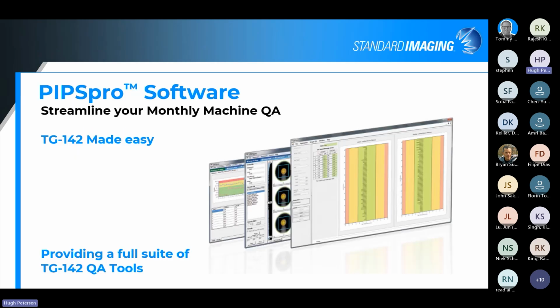So that's an overview of the CT simulator component of it. But just a quick overview of PIPSpro in case it's been a while or you're not familiar with it. Essentially, it's TG142 made easy. We have automated results for just about every aspect of the system in your department, meaning Linacs. Not only the MV imager but the KV imagers. The cone beam CT component, utilizing any one of our three phantoms. We've got an MV phantom and a KV phantom for 2D imaging QA, and then utilizing the in-house CT sim.